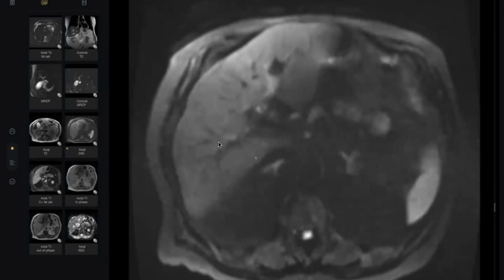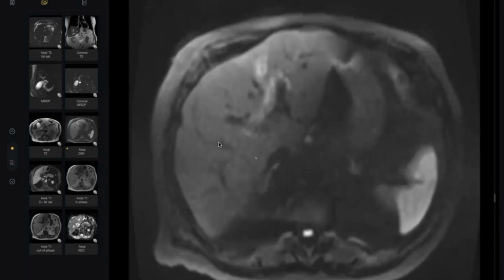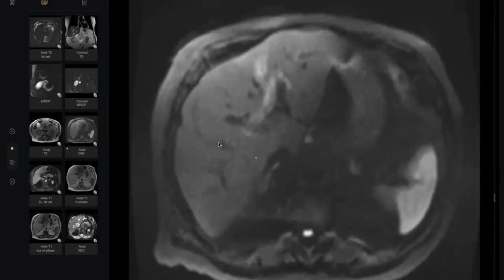No, no. See, we have some pancreatitis, and what happened for the biliary tract here? What is this? This is a periductal... maybe cholangitis.